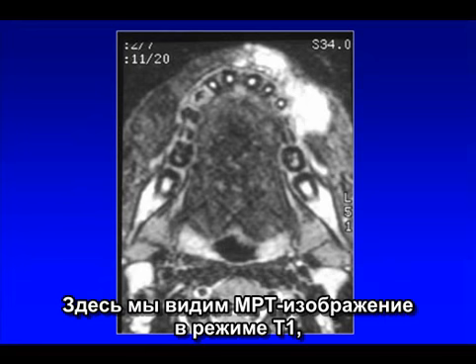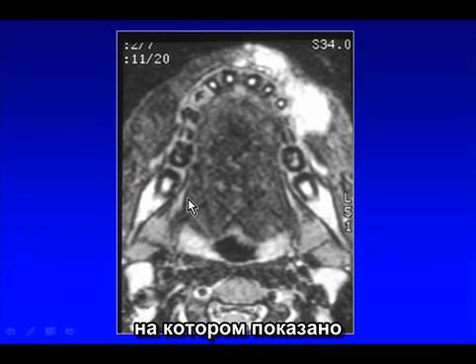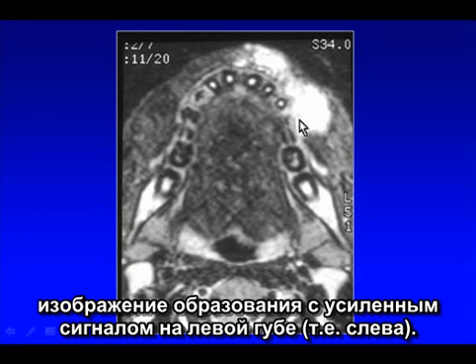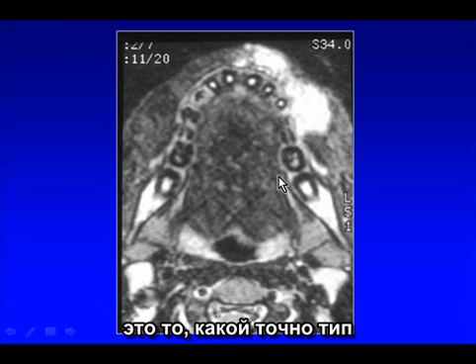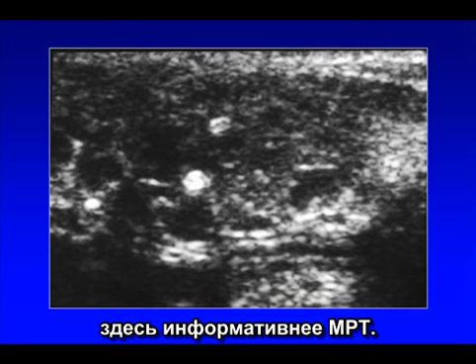Here's an example of an MRI which showed on T1 enhanced images an enhancing mass in the left lip. But what this MRI does not tell you is exactly what type of flow is present within this presumed vascular lesion. And that's where ultrasound is a very nice adjunct to MRI.